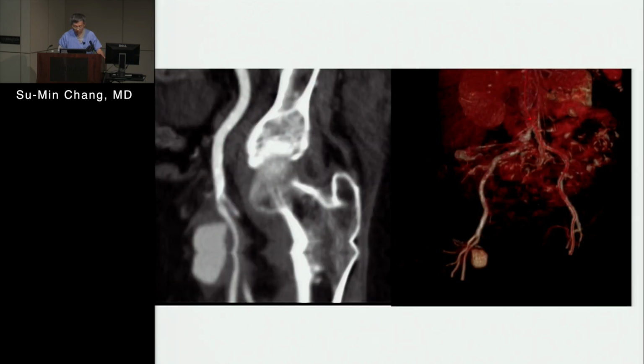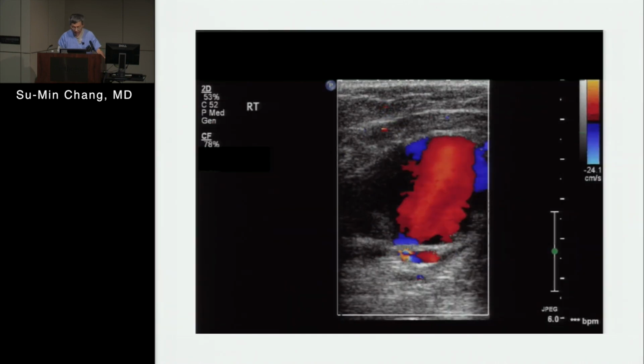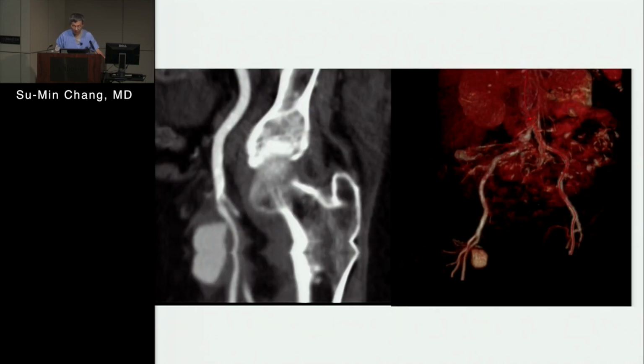So this is the common iliac, external iliac, and femoral here. Post-cath. Patient who had cath in a hospital south of here in the medical center. Pseudoaneurysm, okay. The stick probably is too low, right? Okay. So what do you do next?